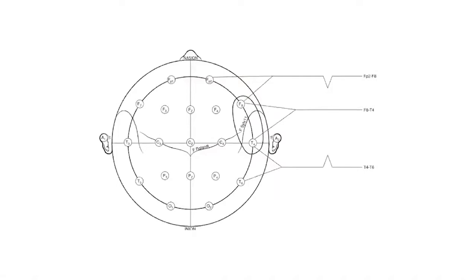I said earlier that we're sampling across the scalp. This is a schema for an arrangement of that sampling where we compare the electrical field at the electrode that's just to the right of midnight on this cartoon. It's labeled FP2, to the electrode just clockwise down from that, which is labeled F8. And there's an output signal. And so any output signal of EEG is the comparison of two locations, which is why with Ceribell, although there are 10 electrodes, there are 8 output channels. One has 5 electrodes on each side of the scalp, and that generates 4 output channels. Here we can see 3 output channels coming from 4 electrodes.